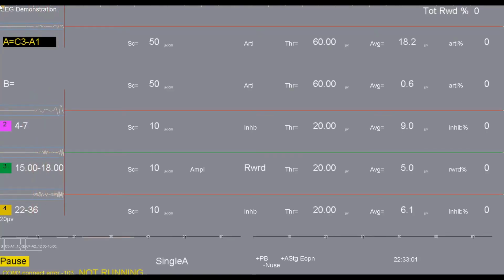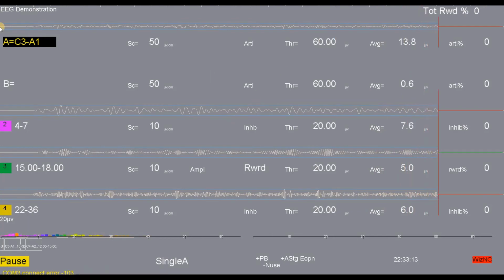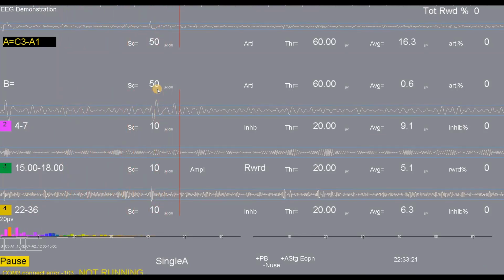So here we are, the screen you all know and love. You're going to see the clinician screen here, but you won't see the client screen. And that's fine. You don't really need to see the client screen for what I'm demonstrating. And I'm going to do a bit of this. You can hear Orb, though, doing its thing, ready to go.